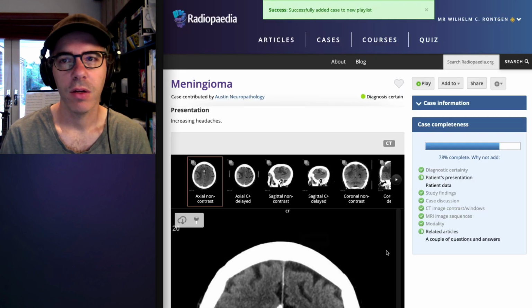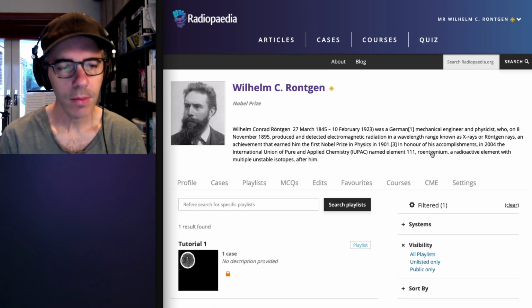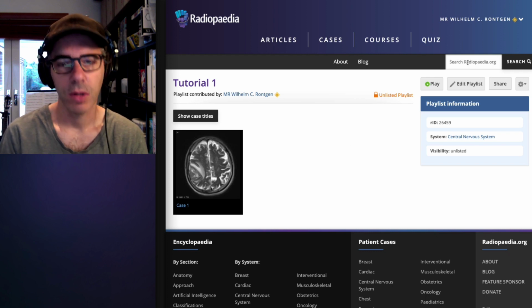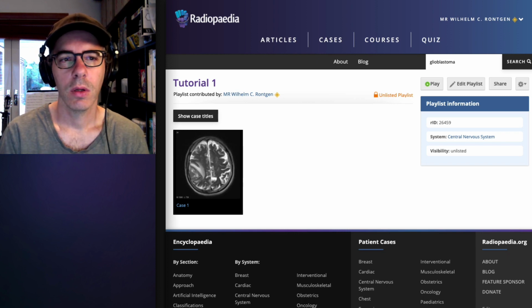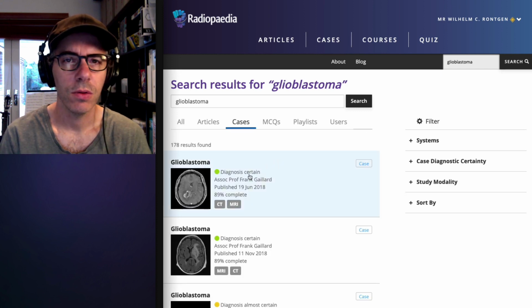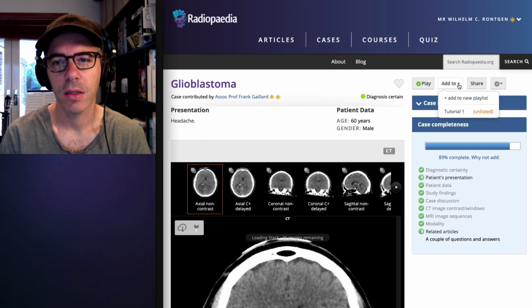So now that you've created a new playlist, if we go and check it out on your profile, you can see that there it is. And currently it contains a single case. But we want to add something else, so let's add a glioblastoma case. And the great thing here is that you don't need to use your own cases if you don't want to. We have over 30,000 cases, so feel free to use any of the cases on the site.